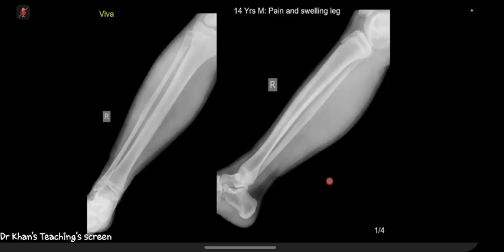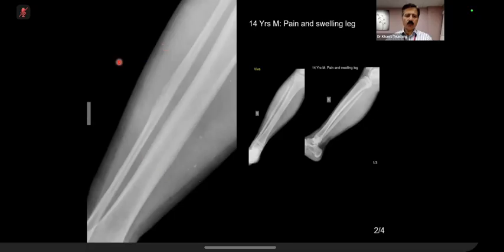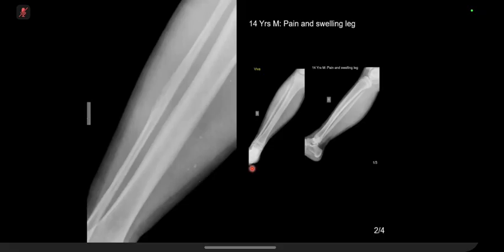So it's a 14-year-old patient with a tibia and fibula, AP and lateral, who has pain and swelling. On the frontal view, I can see the fibular diaphysis has irregular cortices on the lateral side. Because you have picked up, I have given you a blow-up. Over to you. There is a kind of permeative appearance to that segment of the fibula with cortical irregularity.